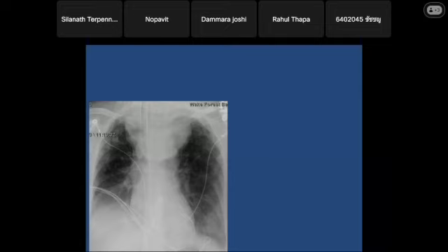I think I can see a really big, maybe a mass on the upper side, like in the center. Yes, there is a big mass. When the mass is big, we have no idea where it's coming from. When the mass is medium size, that's the best time to tell where the mass is coming from. This one, I have no idea. If we don't see the patient, we just say, oh, big, either a mass in the neck itself, like soft tissue outside, or a mass in the mediastinum, because it's so big now, we cannot tell. Okay, let's look at the CT.